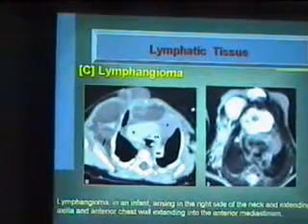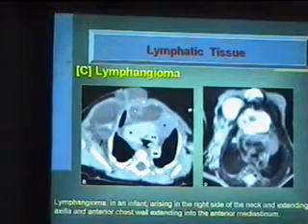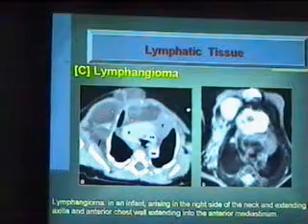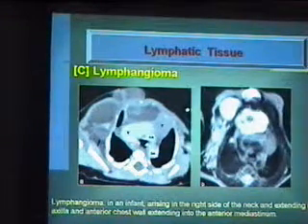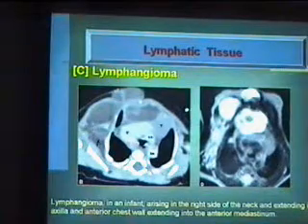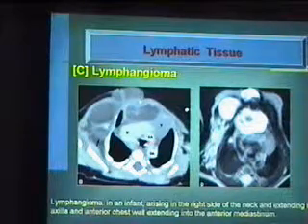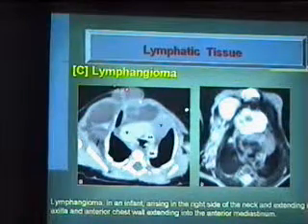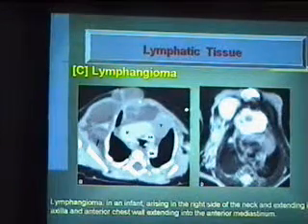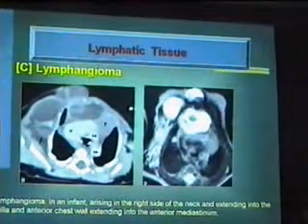And this is another case of a lymphangioma in an infant arising in the neck and extending to the anterior mediastinum as well as into the anterior chest wall, as we can see. You see all the vessels: this is the left innominate, the superior vena cava, the ascending aorta, and the trachea is all displaced downward. And this is the lesion in continuity with the one coming from the anterior chest wall. And this is its MR picture, hyperintense on T2 weighted images.